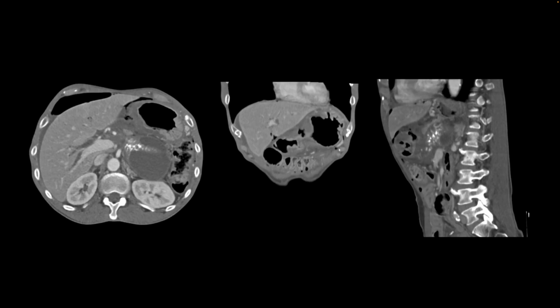Here's our next patient. They presented with abdominal pain, and a CT scan of the abdomen and pelvis was performed. I'm showing you some images, one axial, then coronal, and the sagittal image. Clearly, they have a pneumoperitoneum, and whenever there is pneumoperitoneum, we are looking for ruptured viscus or bowel. Frequently, what I have found is if you trace the free air from outside to inside, it will lead you to the pathology. And so as we trace it here, it's taking us to the stomach right there.